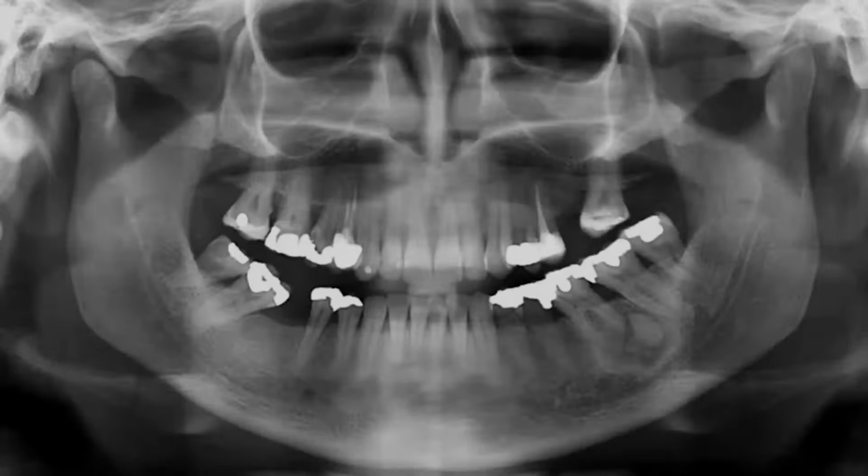One more case of chin being down. Again, we can see that the occlusal plane has a prominent smile. The hard palate is pointing downwards near the center of the film. The posterior borders of the ramus are slightly tipped towards the center of the film. In the left molar region, we can see a disease called periapical cemento-osseous dysplasia. Frequently, this disease happens in the mandibular anterior region. With the chin being down, we do not have a good recording of the anterior teeth. So if there is a disease, we are not able to identify that.